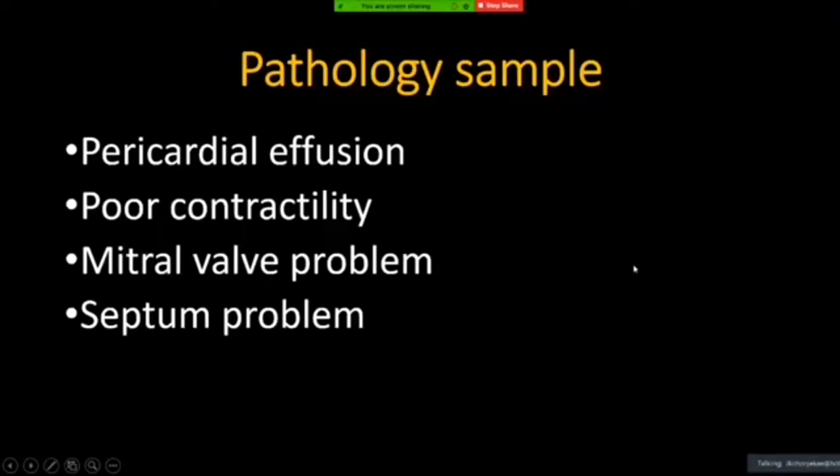Okay, so hopefully, this is quite basic stuff. As long as we know the basics well and can recognize what is normal, it will be quite easy for you to identify what is abnormal, right? So for the next probably 30 minutes, we're going to look at some pathological examples. Once you already know the normal, then you start to identify the abnormal.